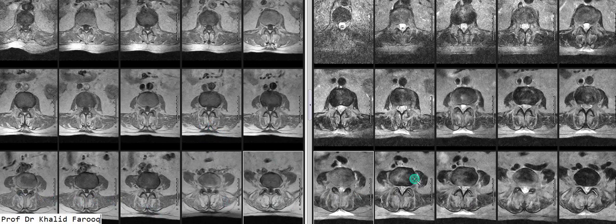So in this case, we have seen that there are multiple vertebral osteoporotic compression fractures. We can assess bone mineral density through DEXA examination, and we have ruled out multifocal infections, and we have ruled out metastatic disease.